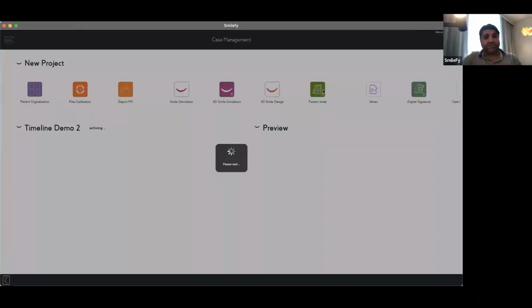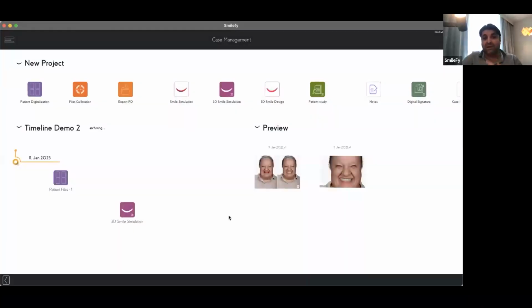You discuss with your patient the form of the teeth, and everything regarding the full arch implant bridge. Now you want to print, and you create a test drive for this full arch implant bridge. And the patient was selecting the files, selecting the templates the way he selected.